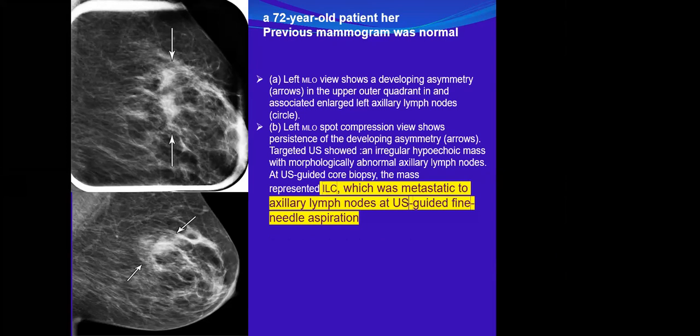The reason is what? As I ask you, yes, it is real, but why does carcinoma not disappear, or why does it maintain its size and shape on spot magnification? Why doesn't it show significant change?